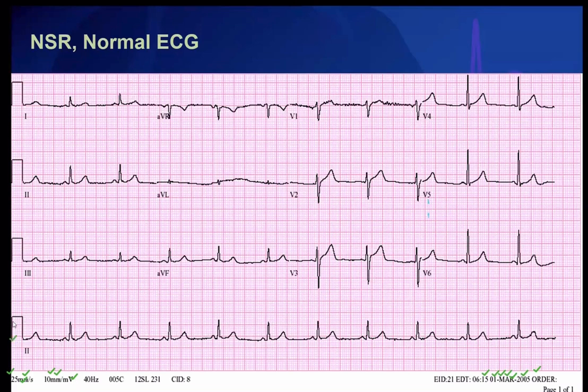And there is a box sign at the start of any ECG you will see in your clinical practice. This denotes the height of the ECG, where every 10 millimeters equal 1 millivolt. Remember also you need to check the date and time of any ECG, because it is important not to mix up this ECG with one from another date while the patient is in front of you.